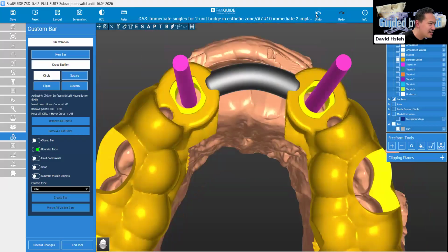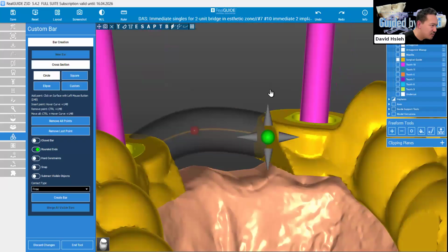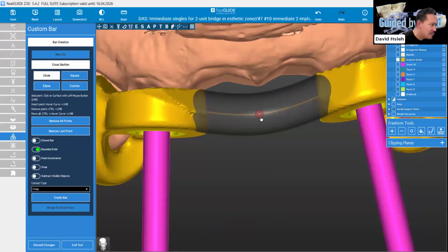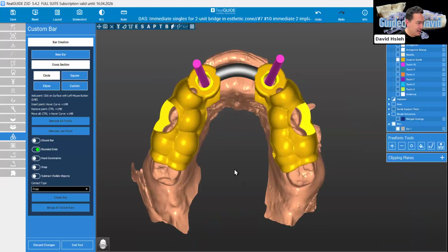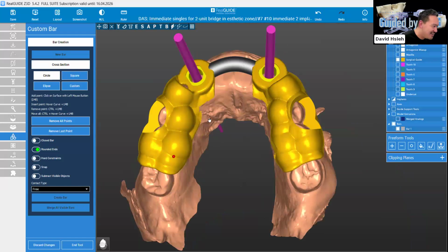And actually this is not a good design because it's on the top of the sleeve. We want some clearance here, here also. We'll do that. We need a bar right here. So one bar might not be enough. Then just create more than that, right? Just keep creating bars like that and that, right?